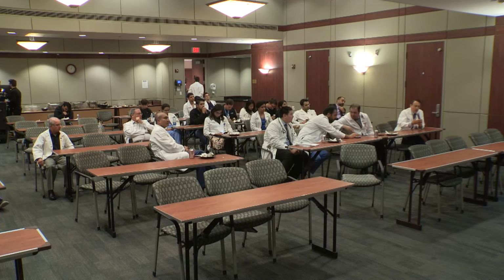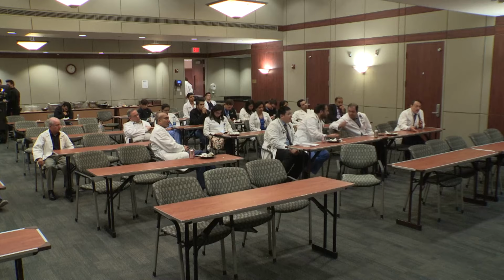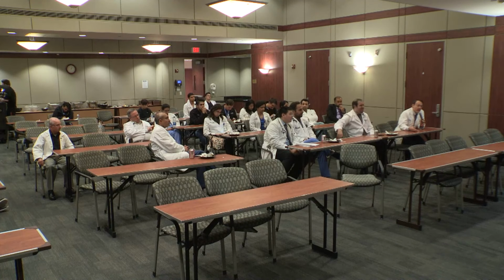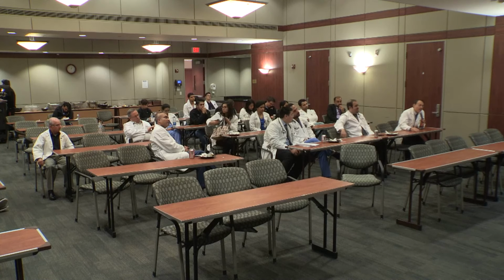And as far as cath, this is also, you were saying, part of their routine that you will do for them within 6 months or so? We do it prior to them being discharged. Prior to being discharged, so you get sort of a stable set of values, and then if you see them clinically and they are fine, would you consider repeating cath again or no? If they're doing fine, we don't typically do it. If they're having complications or if we think that we can't determine their fluid status or RV function by echo or by clinical exam.